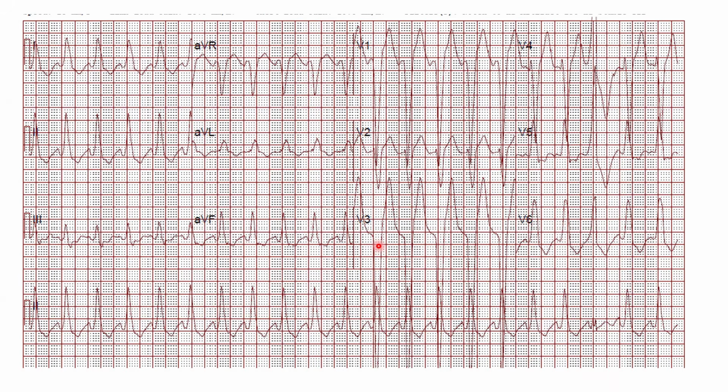That said, left bundle branch block is problematic in terms of STEMI diagnosis, simply because left bundle branch block causes discordant ST changes. So when the QRS is down in those precordial leads V1 through V4, ST will be elevated.